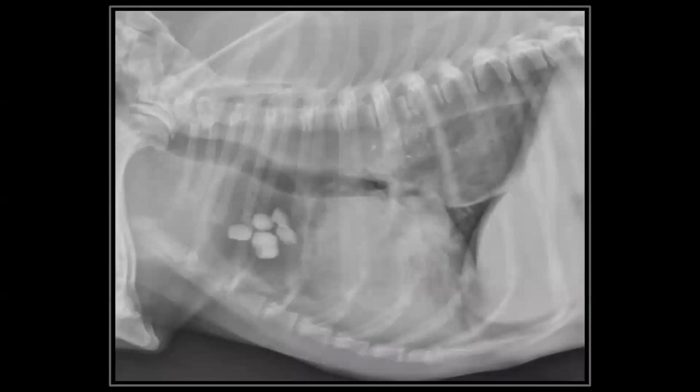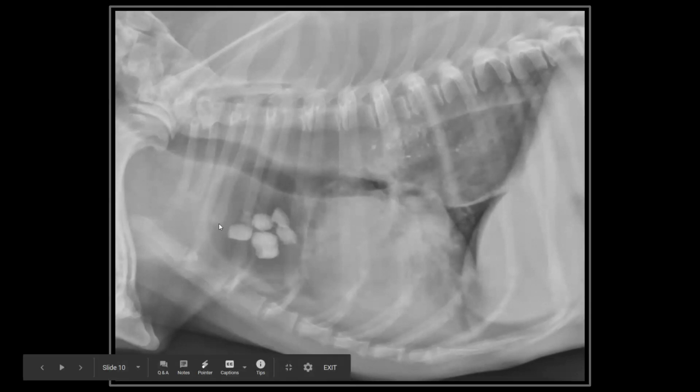Okay. So this is a fun one. It's always, for me, fun to show a little bit of crazy ones. It's how I entertain myself when I'm at work. Anyhow, when I approach a radiograph, a lot of times if I see something that really catches my eye, I mentally have to deal with that first. So we're going to deal with this first.